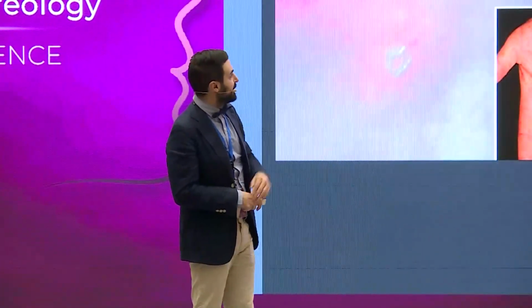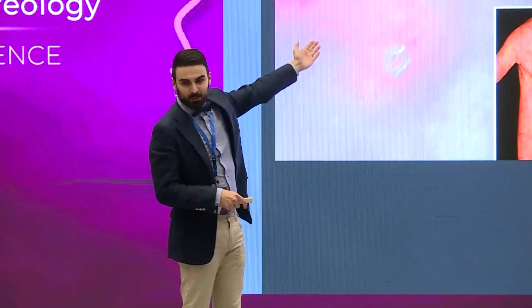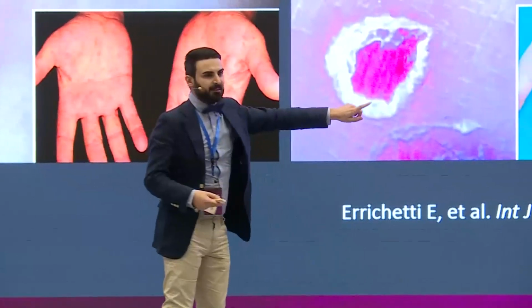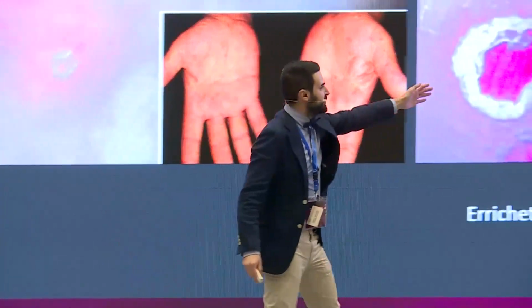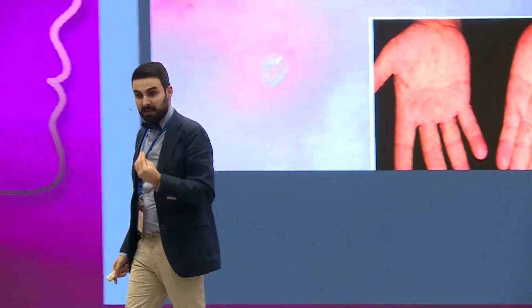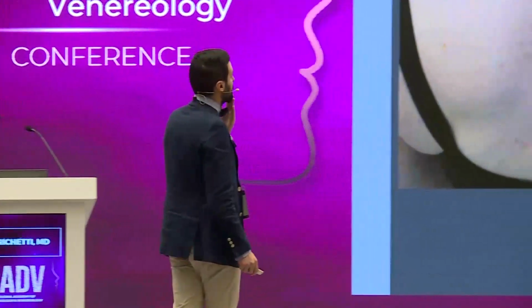Another case. Which one is syphilis? No, both. This one, orange. Because the peripheral collarette is not pathognomonic, come on. It may also be seen in psoriasis. This is psoriasis. It's the color of the background which may help us make the diagnosis. This one is syphilis.